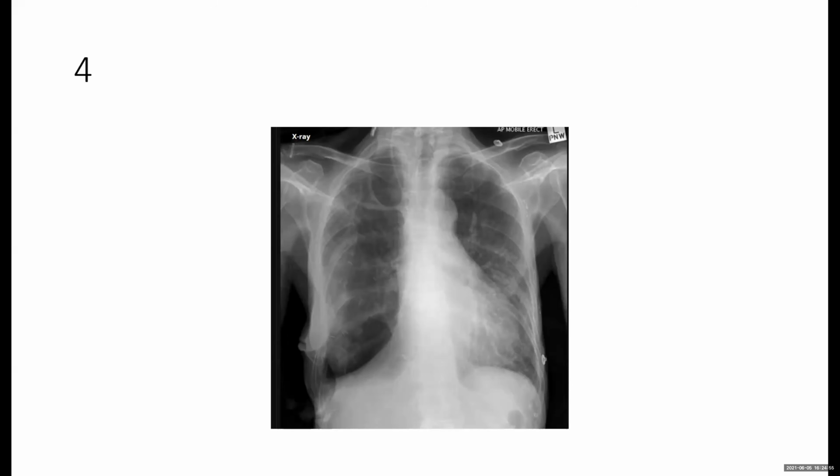However, there is some low density in the lower zone, maybe due to gas. So, either pneumothorax or something projecting over the lower zone.